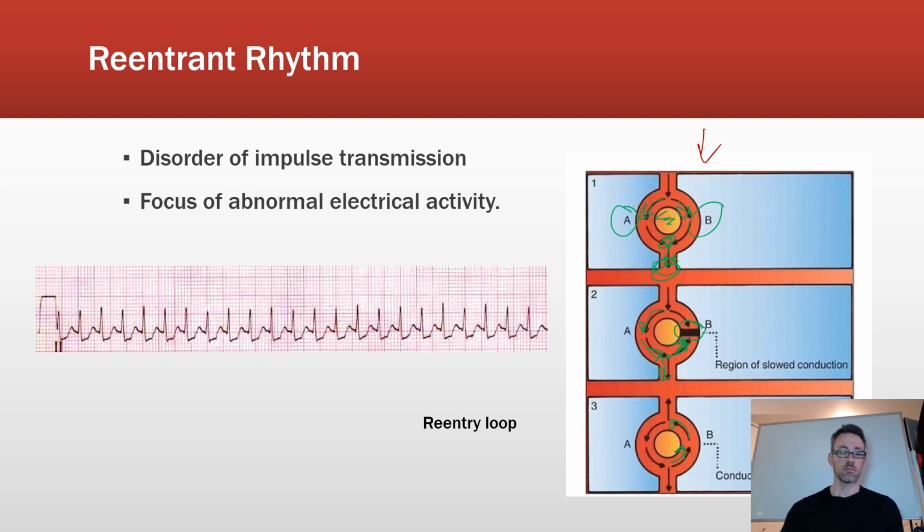Okay. Now, what you're seeing here in this lead over here, in lead 2, is you'll notice a very fast rhythm. So it's tachycardic, very, very regular. Okay, and this can occur. You can get this kind of tachycardia where the beats are occurring very, very quickly, but it's a very, very regular rhythm. So it's going around that racetrack at very regular intervals, but it's creating high speeds, high heart rates. We refer to this as a re-entry loop.